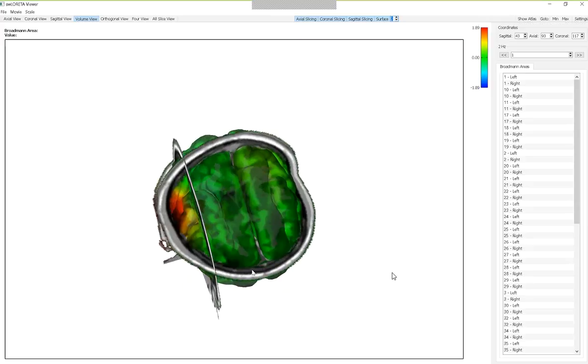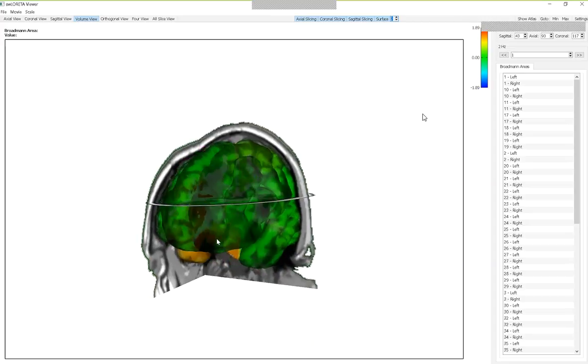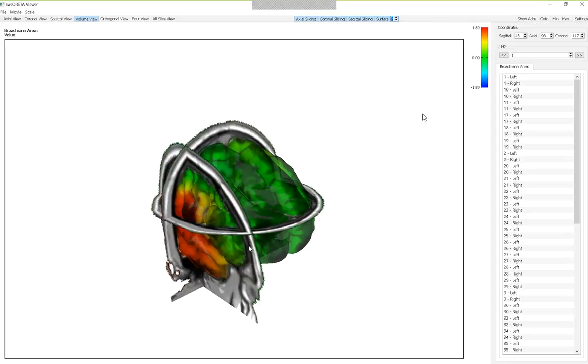And we're going to rotate and then go up and down in that volume. There's a color bar over here that allows you to immediately evaluate the z-scores based on their color, or the current density if it's in raw scores that one is looking at. And also, as one navigates and moves the mouse around, you can see what the Talairach atlas coordinates are. Now we're looking at the healthy hemisphere, and I'm moving it over to the right hemisphere so you can see the deviation from normal in this individual who has a brain injury.